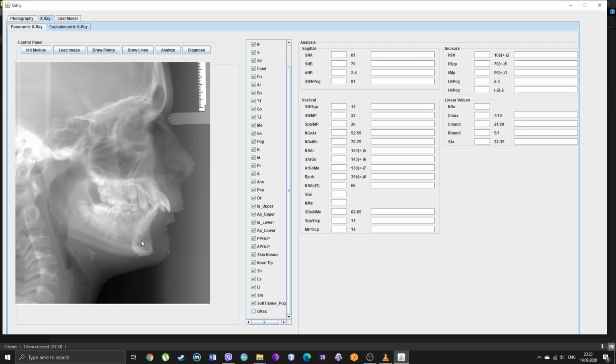Now this is important for this value here, so it should be somewhere around here. Yes, I should correct this, but I don't have time again. But everything is fine. We'll see. Now we draw our lines, and as you can see, it's perfect. Everything is drawn. All the lines are drawn.